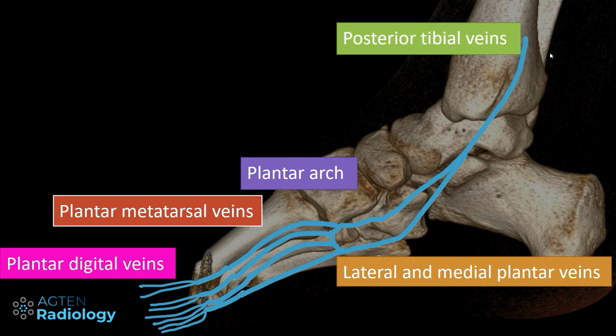And keep in mind that these veins are typically, at least in that region, two veins running parallel to one artery. So if you see a couple of veins going down next to each other, they belong together. So it's not like it's just one. Just something to keep in mind.